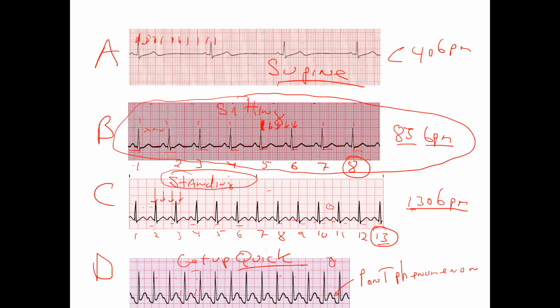So here the baroreceptors kicked in nicely. It increased the heart rate to, what are we going to pick here? Let's start at 4, 7. I would start on this one and I would do 300, 150. So the heart rate is 150 beats per minute. You feeling comfortable with this? Being able to do that? BPM, that's BPM. So that's completely appropriate, 150 BPM with a quick get up.